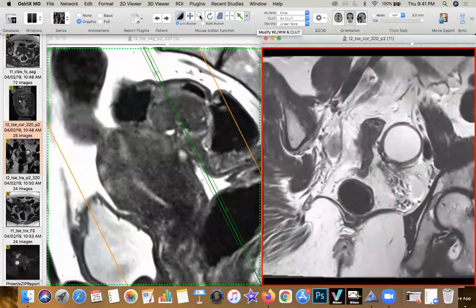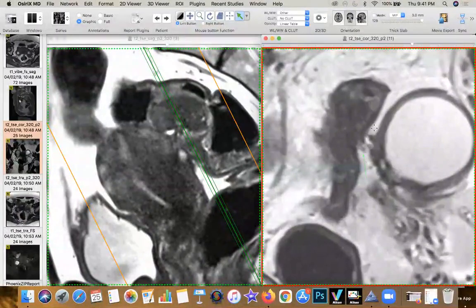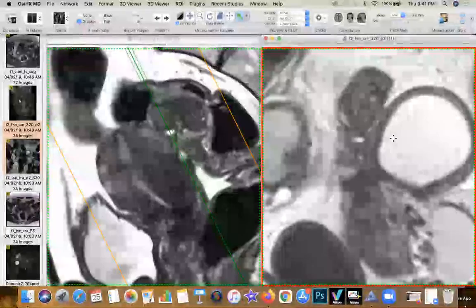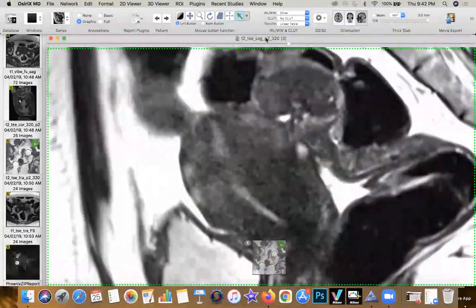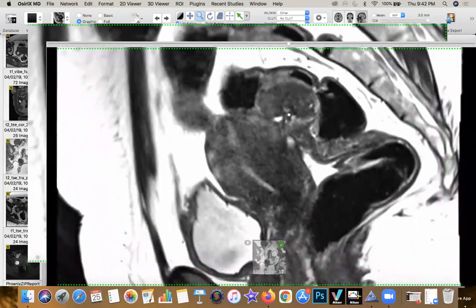And you can appreciate how the gap is obliterated between the ovary, the corpus, and the rectal wall. And you can see those lovely fibrotic strands which are emanating from the surface of the corpus and are actually penetrating through and through the thickness of the rectal wall. Now, what do we have here? So this is a classic case of a mid-pelvic endometriosis, which has now infiltrated the rectal wall. And what you have is a mid and a posterior compartment presentation of deep pelvic endometriosis.